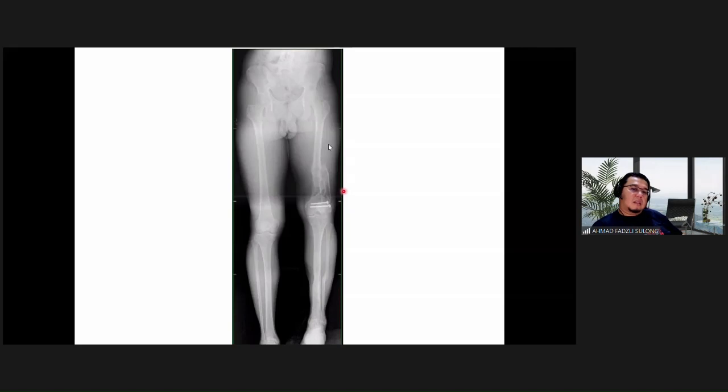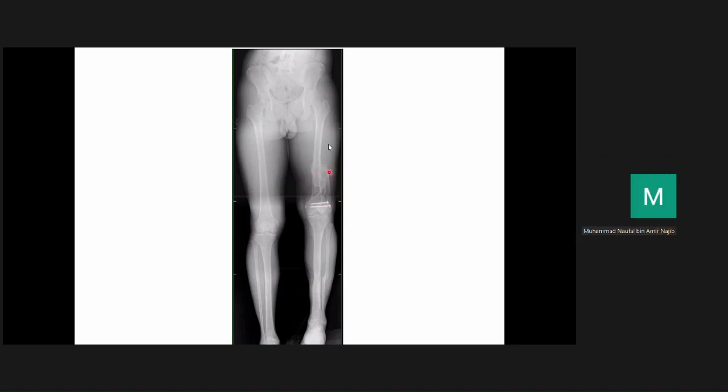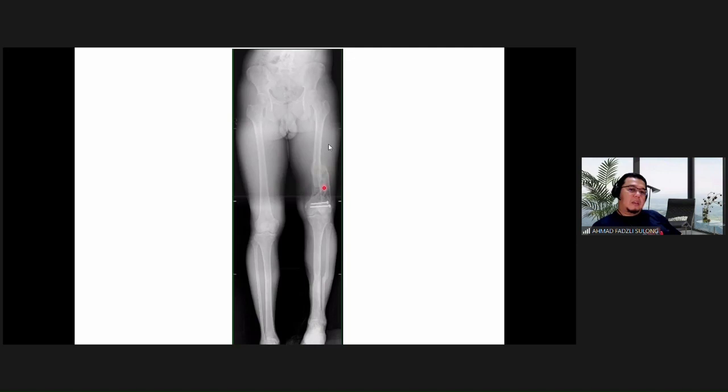So in this case, the previous fracture, kalau kau tengok AP ni, Naufal, it is actually a segmental. This is one segment. This segment beralih ke tepi and then was displaced to the lateral and then dia jadi shortening. And then this whole gumpalan united together, so it jadi malunited, right? So what deformity can you see here? Is it the same as this normal femur?